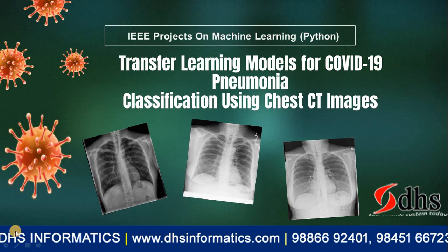Hello everyone, welcome. In this video we're going to see about transfer learning models for COVID-19 pneumonia classification using chest CT images. So this is a multi-class image classification project. Here we have COVID, normal, pneumonia. So like that we can have some targets.